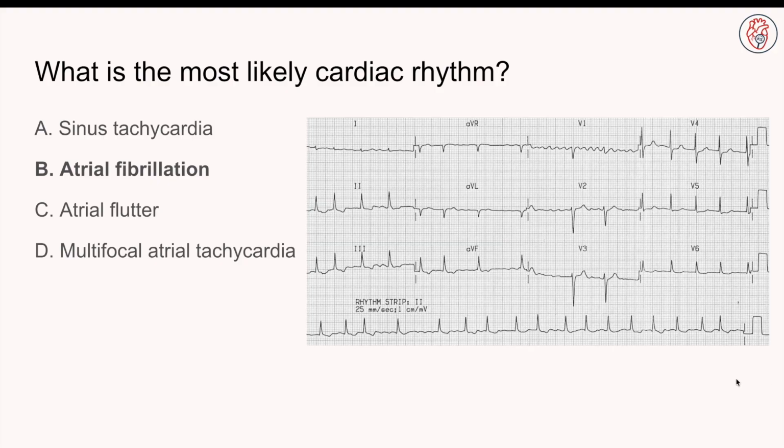And why do we know that? If we look at our EKG, what's one of the first things that maybe your eyes are drawn to? And I really hope you're looking at this rhythm strip down here and you're seeing that these points here are not equally distanced apart. We have a variable R to R ratio. We know that this rhythm therefore is irregular. And if we look, there's no pattern to it across time. So it's irregular. And when you hear that, I want you to just channel the energy from all the EKG gods and know that this is atrial fibrillation. If you see irregular in a STEM, or you see it on an EKG, that is AFib.